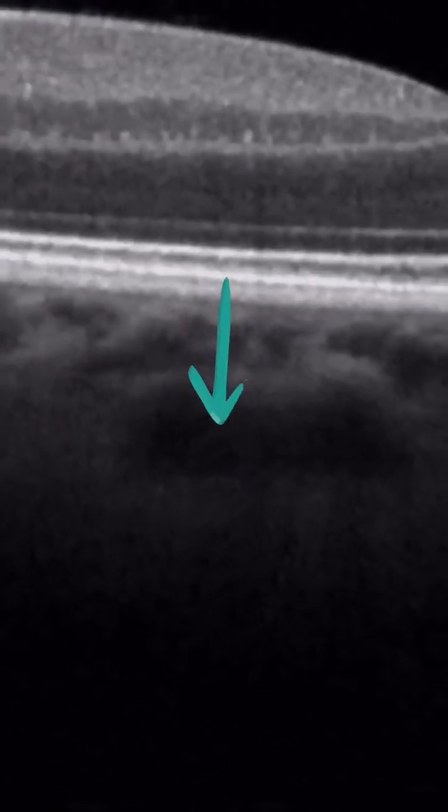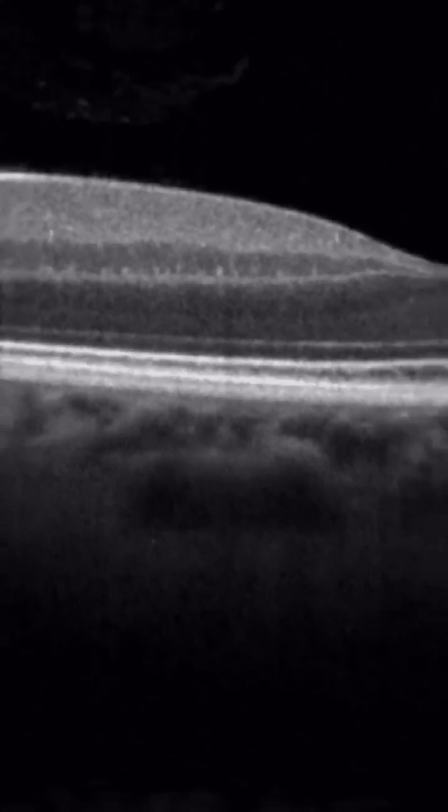Oh, and the last thing I look at is the choroid. You can see, for example, just below the RPE, the blood vessels are pretty small here. You can see those dark areas are the blood vessels. And here, for example, is a good example of a large choroidal vessel, okay? All right, let's look at some examples.